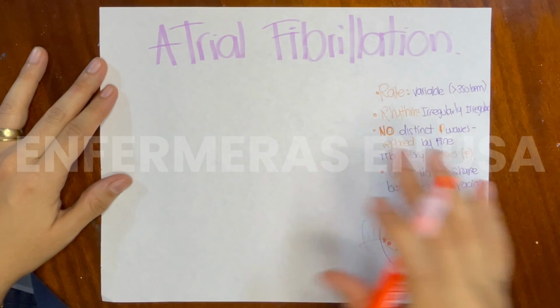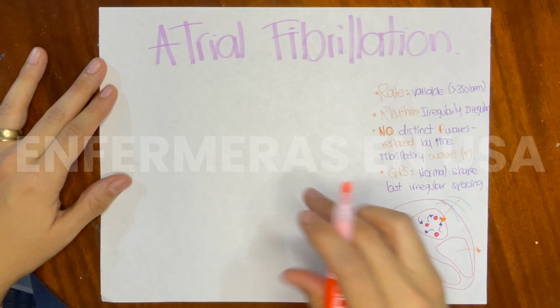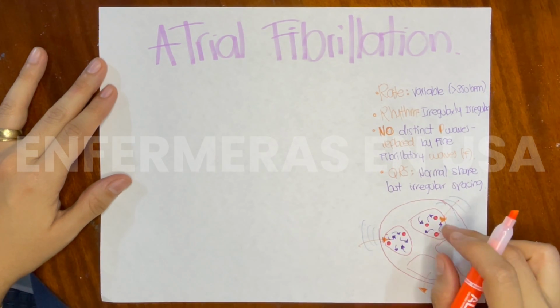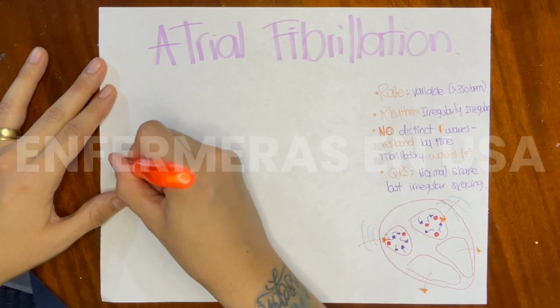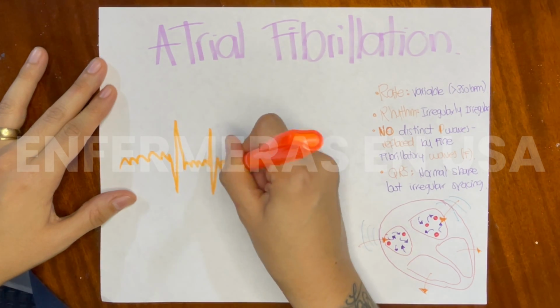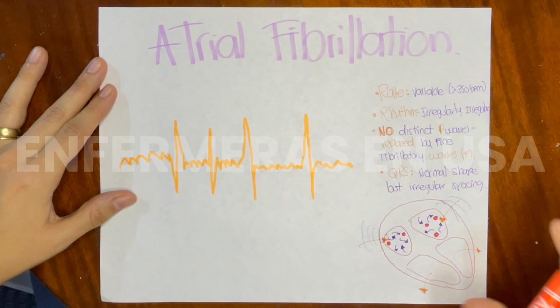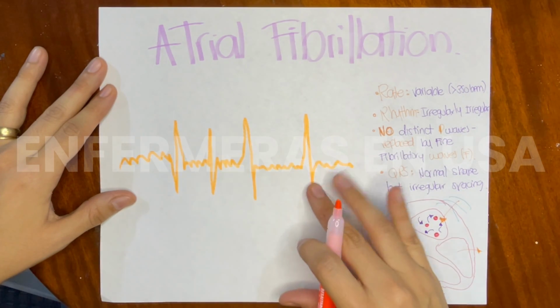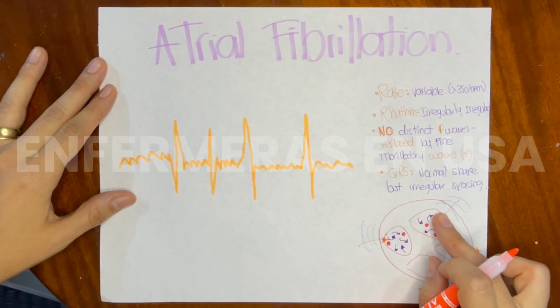Now let's move to a very common arrhythmia, atrial fibrillation, AFib. In this rhythm, the atria shake in a disorganized way without producing effective contractions. Visualize it like this: instead of an ordered PQRST sequence, you'll see a chaotic tracing with no defining P waves and R peaks appearing at irregular intervals. It looks like an electric rainstorm on the EKG line, which can cause clots and often requires anticoagulant therapy.